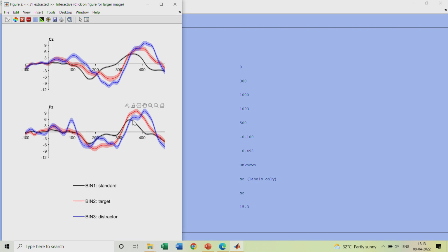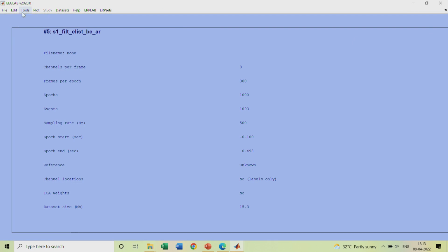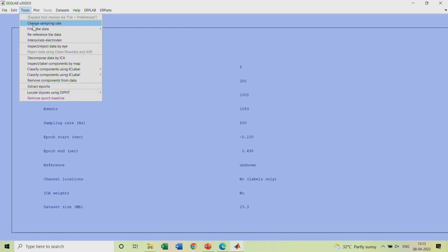The SEM is nothing but your variabilities. During all the 100 trials it would have gone slightly up, slightly down also, but it almost follows this. So this concludes that yeah, you can see this P300, it is there, and it is getting generated using your target or distractor stimuli. Another thing is you can use this to resample if you want. You can do all this re-referencing.